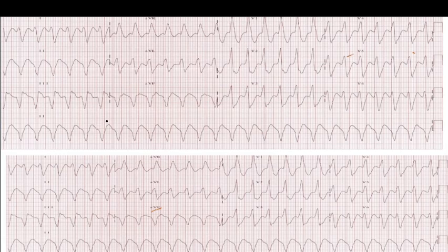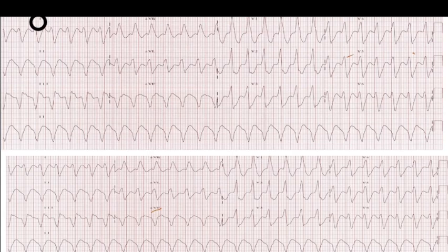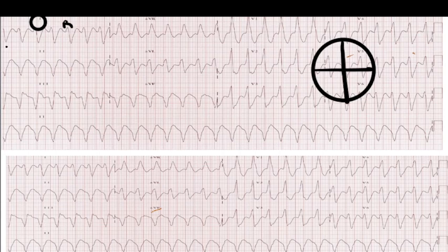In fact, it's really difficult for you to find this QRS complex. But let's try. This is lead 1. Obviously this is R wave, but here we don't know the baseline, as we can't see any PR segment here. But from the ECG, it seems like this S is so tall, it's going too far down. So let's take R minus S as negative in lead 1.